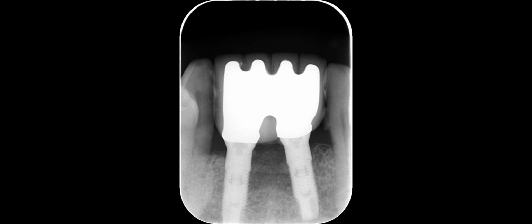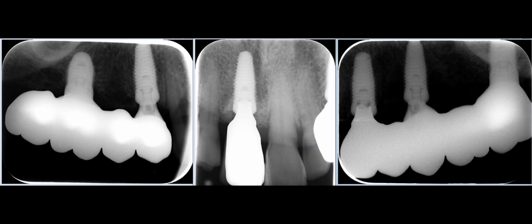So this is the x-ray we took in June, and you can see this is his lower 2 implants supporting 4 small front teeth. Bone levels are very good considering 18 years in service. And if we look at his upper x-rays, also the bone is very good. Upper front tooth bone extremely good around the implant there. All of them are doing very well. This x-ray is a bit dark because of the relative contrast of this big zirconia bridge that prevents us from seeing this very clearly. But everything is in good order.